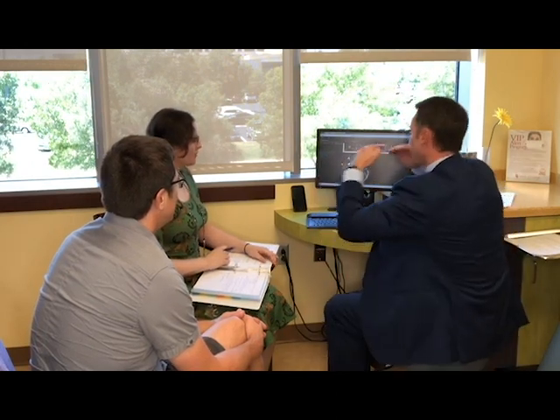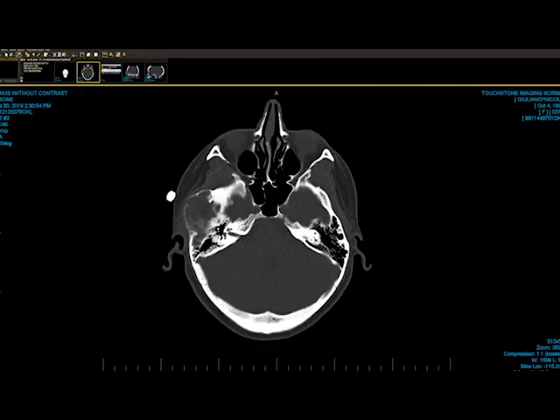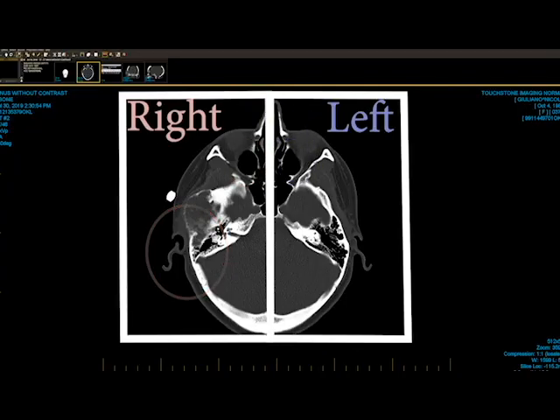And so these are cross sections like this. So that's again, this is the left side. So the right side of the screen is the left side of your body. So left ear, left eye, nose, right eye, right ear, back of the head.